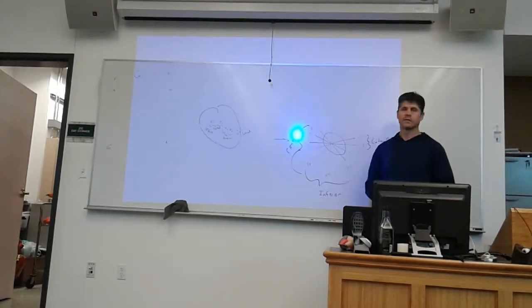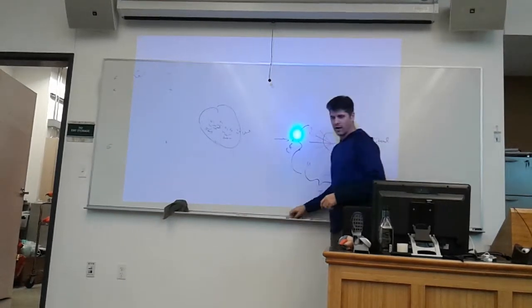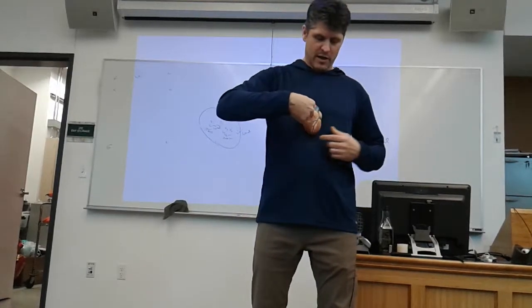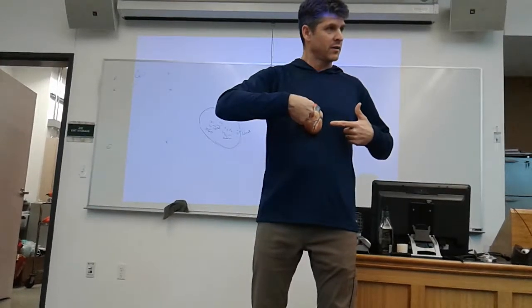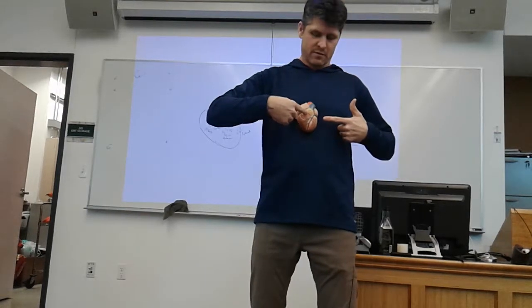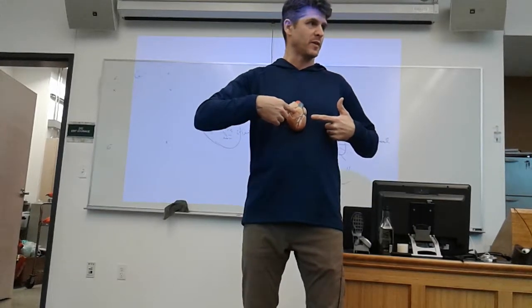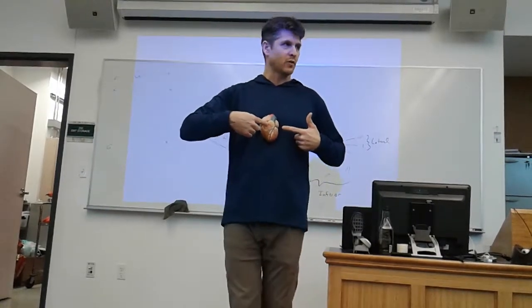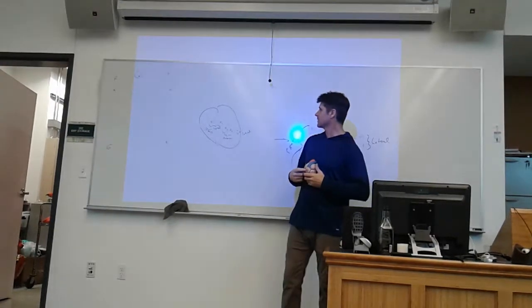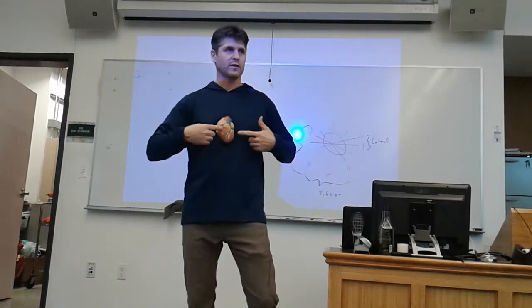V1 and V6 are looking at the same direction, but from opposite sides. V1 is located here, and V6 is located here. So they're looking right across each other. They're about 20 degrees off, close to about 70 degrees in between. No, greater than 90 degrees between them, 110 degrees. But they're crossing at the same point, the interior of the heart. So all of the precordial leads travel to the center of the heart.